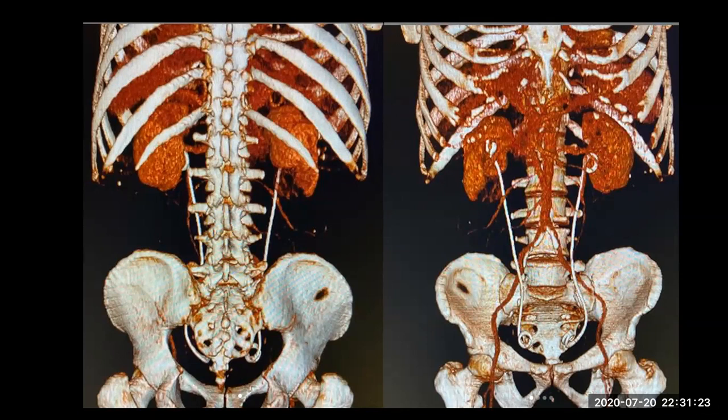Which one is in the anterior and which in the posterior position? The left one is anterior. The left one is posterior, you see the spine here, okay? And the right one is anterior, okay? What is this here?